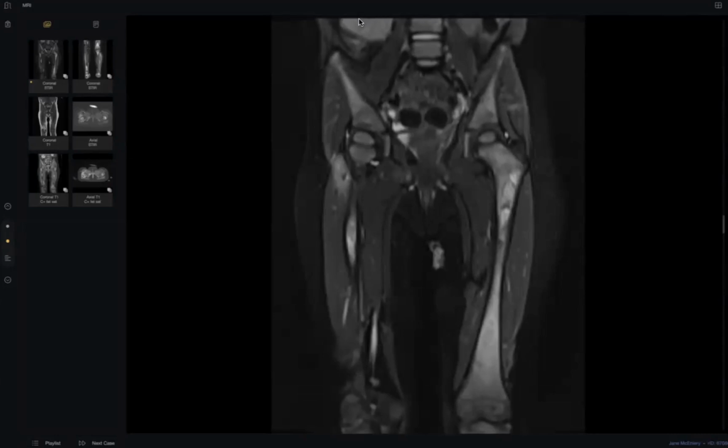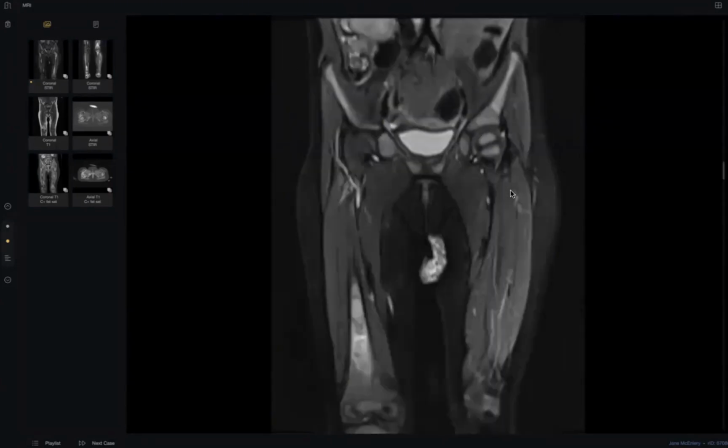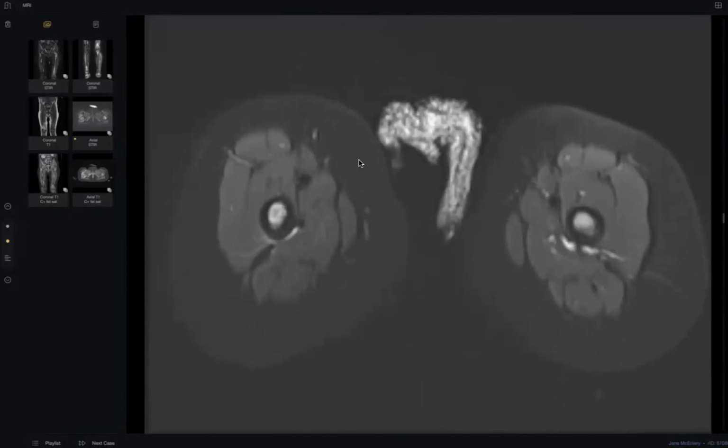Very important. Here this is a left renal or suprarenal mass. Description of this bony metastasis is very easy. The examiner sees the bone is completely infiltrated. The examiner wants from you, as a potential consultant of radiology, what is beyond the standard.